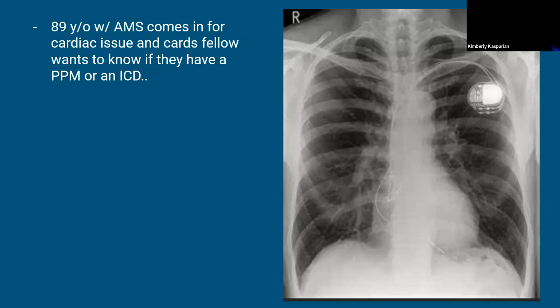All right. Here's a crappy chest x-ray, but a clinical scenario you may run into. An 89-year-old Meemaw comes in not looking right. Family dropped her off, no history. They think she may have had a cardiac syncopal event or something. The cards fellow is like, do they have a pacemaker or an ICD? Because I'm the cards fellow and I don't want to come interrogate it. And you're like, I don't know. I'll find out for you.